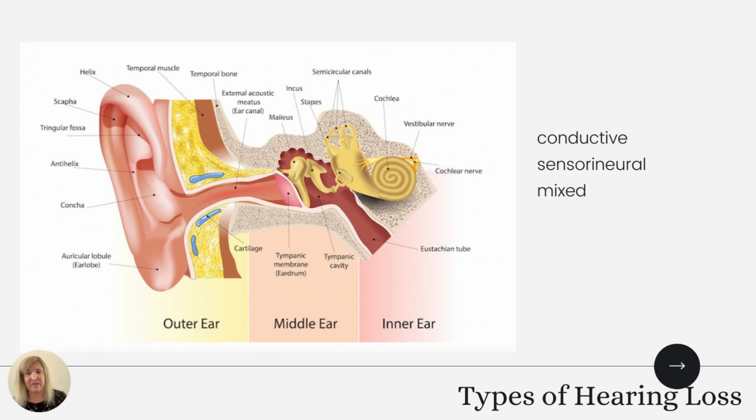In addition to the type of hearing loss, other descriptors could be used when describing a hearing loss. The term bilateral refers to the fact that there are two ears involved in that hearing loss. Unilateral refers to one ear. The term congenital refers to the fact that the hearing loss has been present since birth. The configuration or shape of hearing loss will also be described. Some descriptors of the configuration can include flat, sloping, steeply sloping, rising, cookie bite, U-shaped, precipitous, or notched.